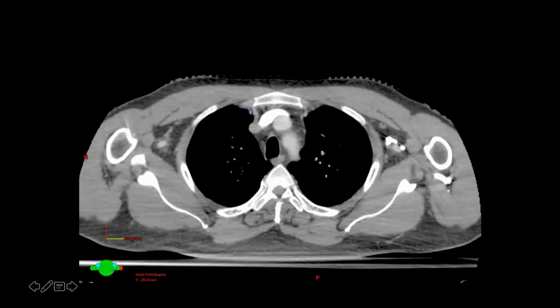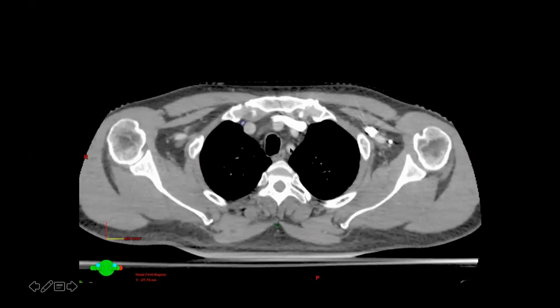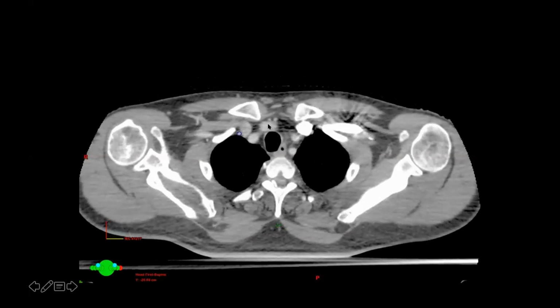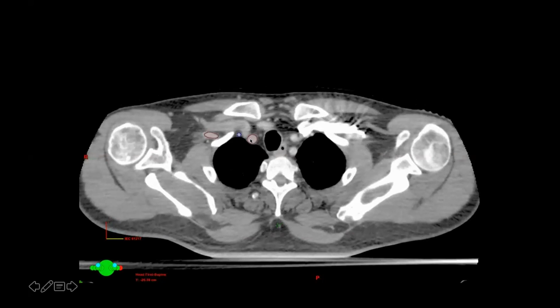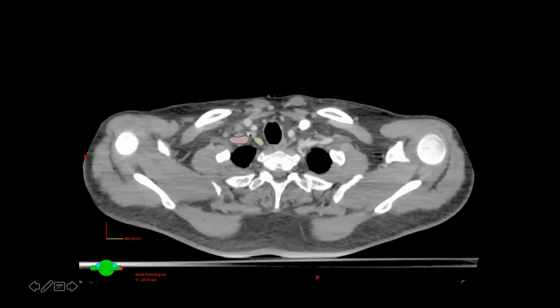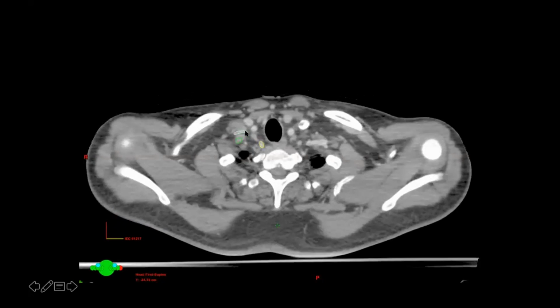Okay, so here I've come back to the arch of the aorta. Here you can see your three vessels. Here is the brachiocephalic trunk. The brachiocephalic trunk divides into the right common carotid and the right subclavian. We know that transverse cervical is a branch of the subclavian, so we'll track the right subclavian over here in this case. This here is the subclavian. Over here, you can see this is the transverse cervical branch. This will go transversely into the neck. So this here is the transverse cervical artery.